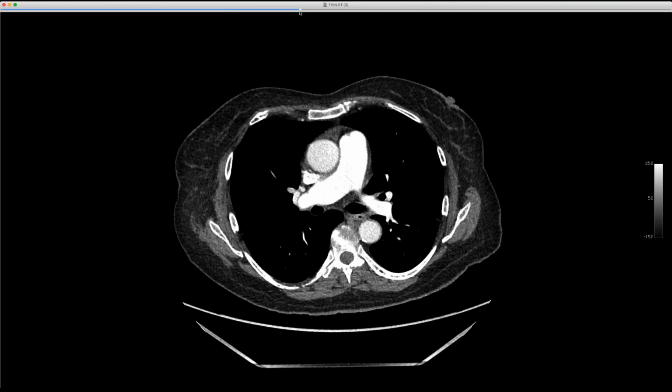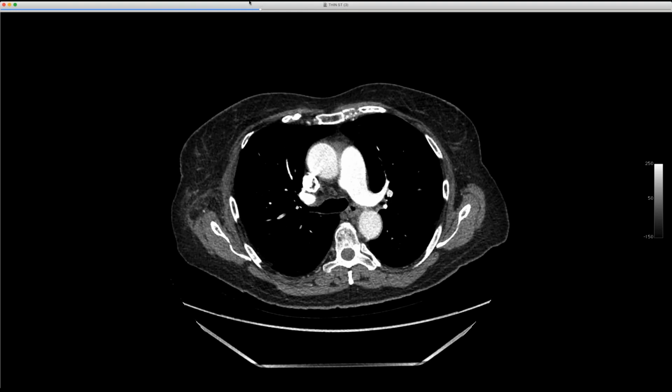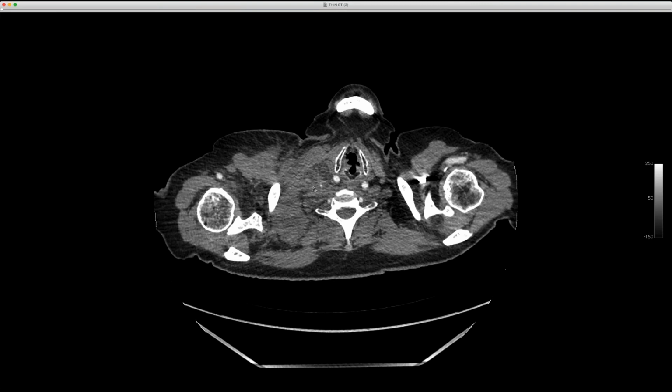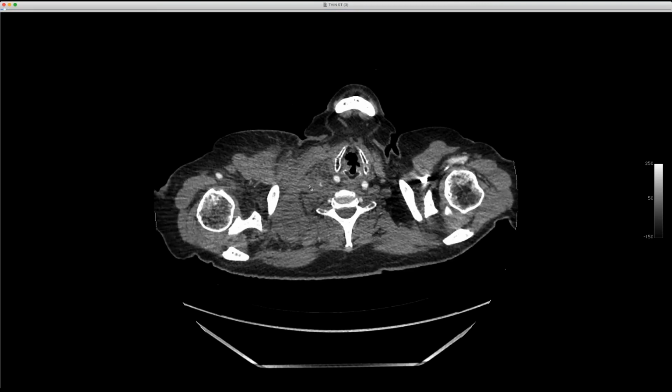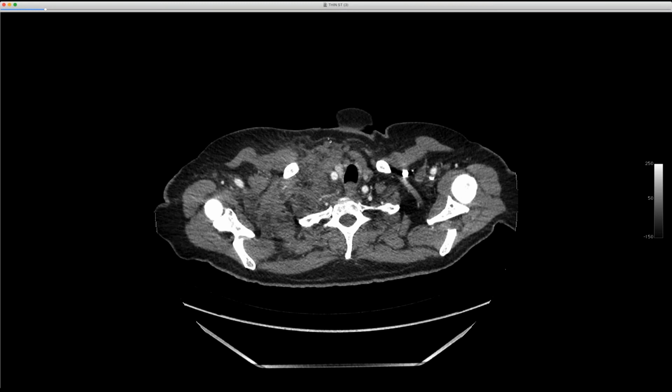She did get an abdominal CT. It showed a mass in the mesenteric fat. And then a neck CT just showed more of this necrotic stuff. So we assumed this was some kind of metastatic disease, and there was an adrenal mass, some kind of metastatic carcinoma coming from somewhere with extracapsular spread. But we didn't know what it was. And she had a big hematoma on her left anterior abdominal wall, which no one could really explain.